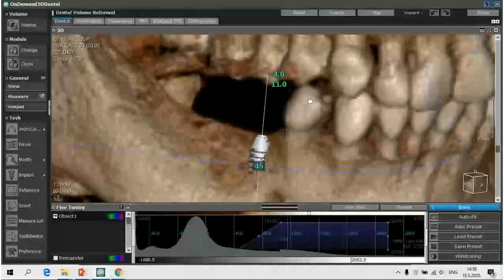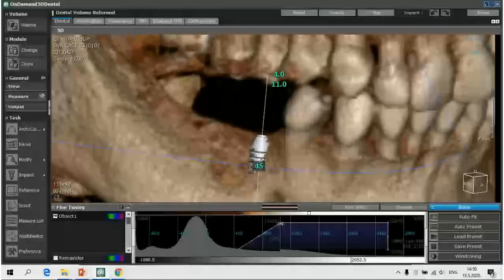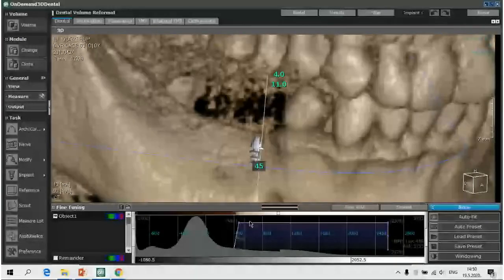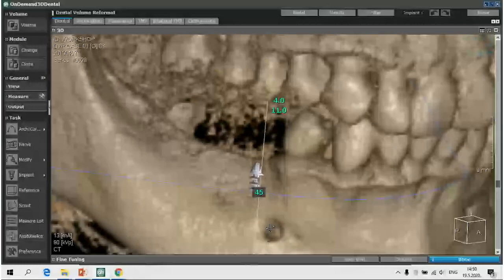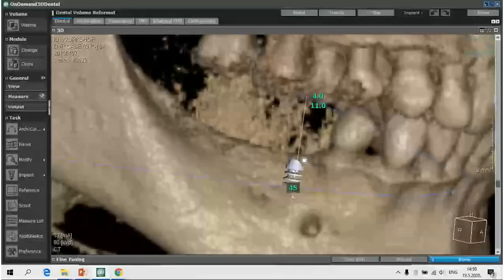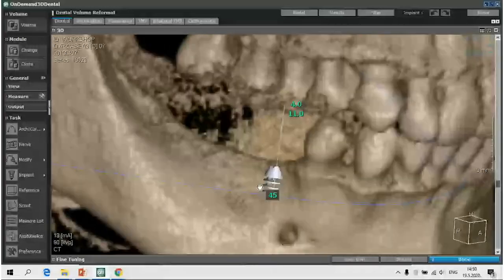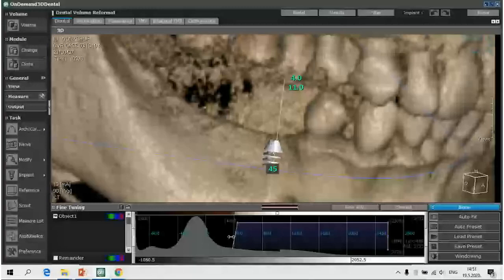Also, I would just stress, although it is not the main issue of our presentation here, that we should always be a little bit reserved when we are looking at this three-dimensional reconstruction, because the sensitivity of the appearance can be changed. So probably this is the most probable situation that we will encounter in the mouth, and we should look for assessment after the correction of these data.